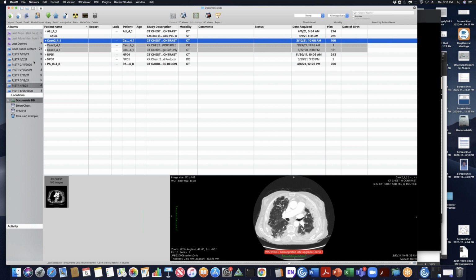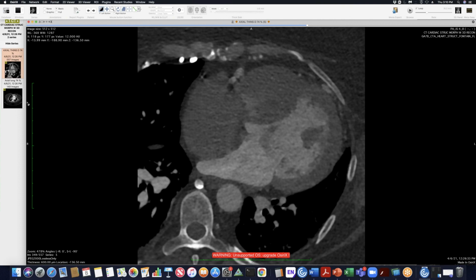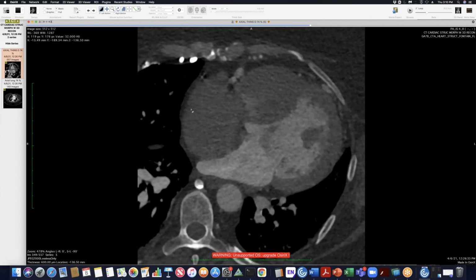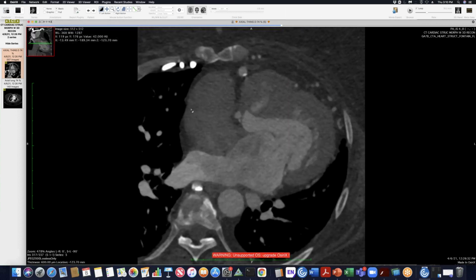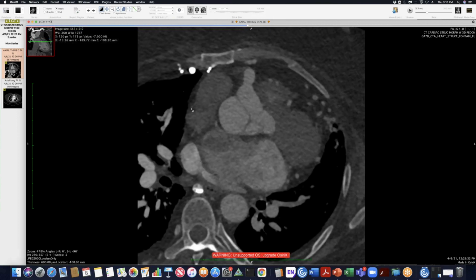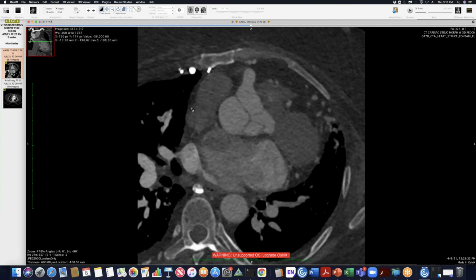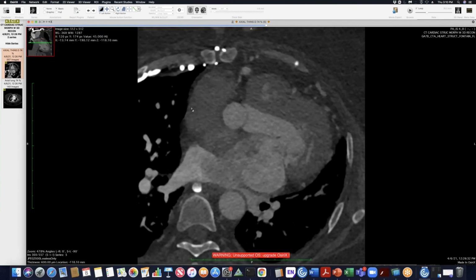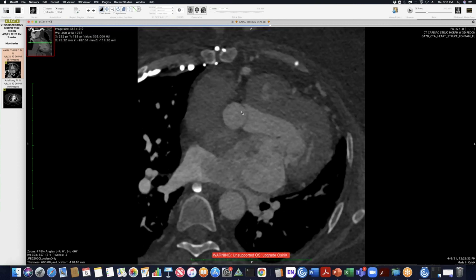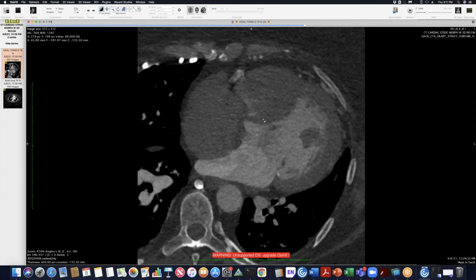And then I'll show one other one. This is another one I looked at recently. It's a congenital cardiac case, so just a lot of interesting physiology here. The patient's now in her 20s, and she has a congenital cardiac history. She has pulmonary atresia with intact ventricular septum. She also has tricuspid atresia. She's been repaired, so essentially what we have now is basically single ventricle physiology.